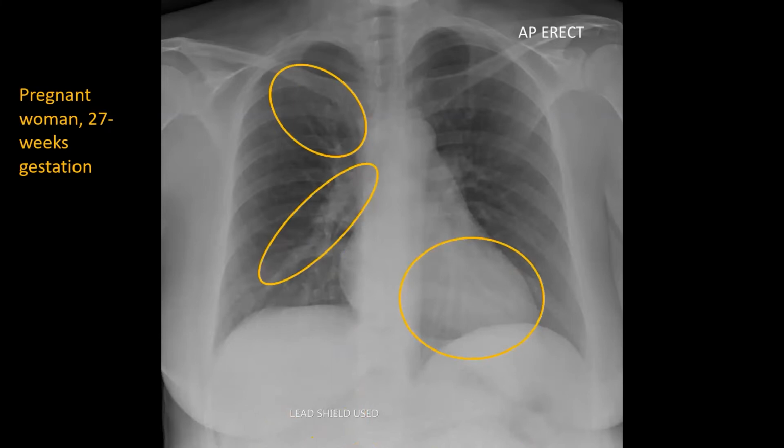Perhaps the right pulmonary artery shadow you might mistake for a very subtle infiltrate change, now that you have your antenna really tuned for any kind of findings. If you looked at this film in the lateral projection, and I'm sorry I didn't include it here, you could very easily tell the difference. So I do highly recommend that you obtain both PA and lateral films for that reason.